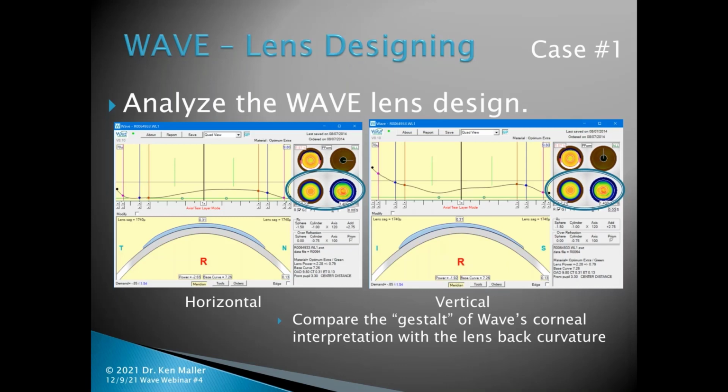So in this particular case, this was a Scout topography. I would expect the colors to look fairly similar between those two and to also be distributed fairly similar. Now on the Pentacam, as well as some of the other topographies, there are going to be some nuanced differences with the original color scales that were displayed on the instruments, but Wave is still going to display this particular color graphic regardless of what it looked like on the actual topography measurements and the scale that you happen to have displayed.